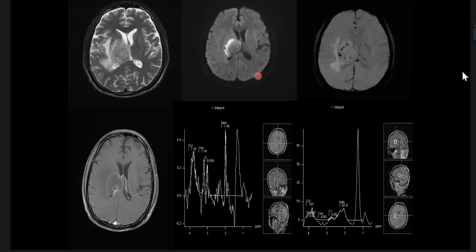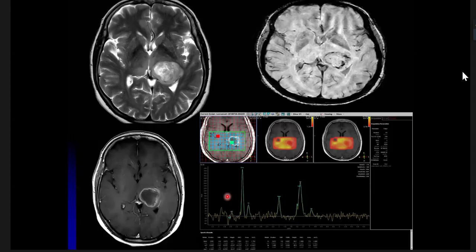I can't see any other lesion. With spectroscopy, except for the lipid lactate peak, the rest of the peaks are not significantly elevated or reduced. This is how you describe it. So on that basis, what history would you like to know and what would you like to keep as a DD? Okay, come to the one point. So describe this now. This is a contemporary case for the same.